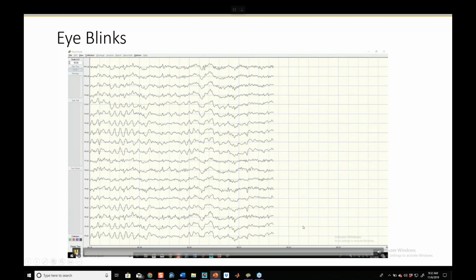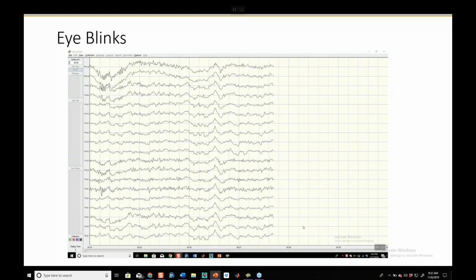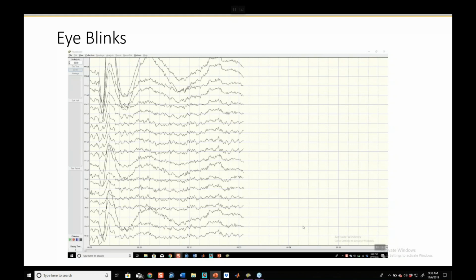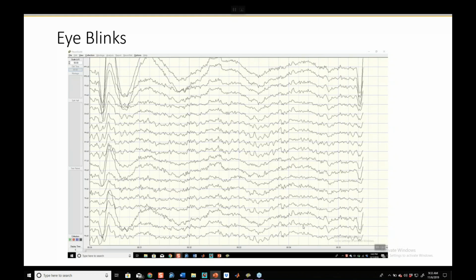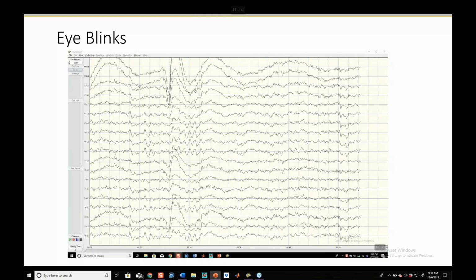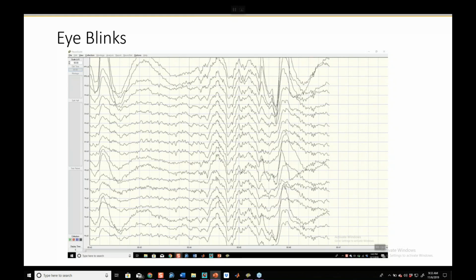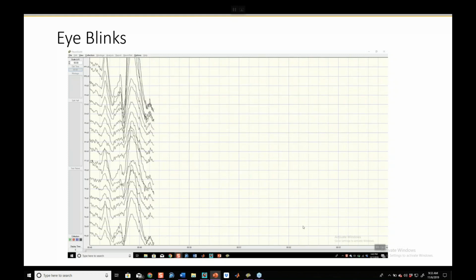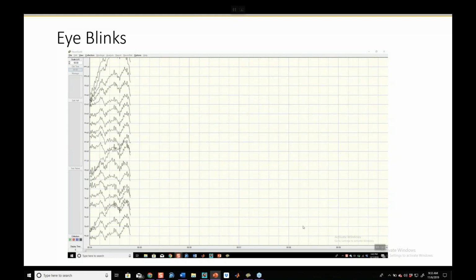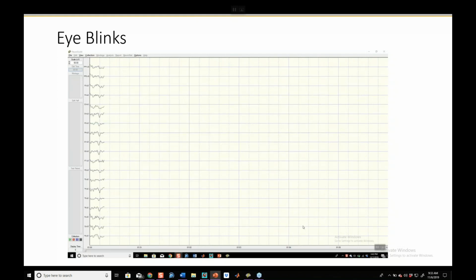On to elementary EEG, eye blinks, right? So we all know how to identify it. It's going to be coming from FP1, FP2. The eyes are powerful dipoles, and so every time you blink, they actually dip up and down, or bounce up and dip down. And so they have a positive and a negative polarity, and they cause a wide polarity shift when they move in the data. I believe for this reason is why EMDR is a powerful technique for altering hardwired memories and things like that.